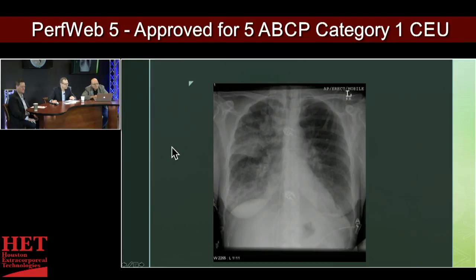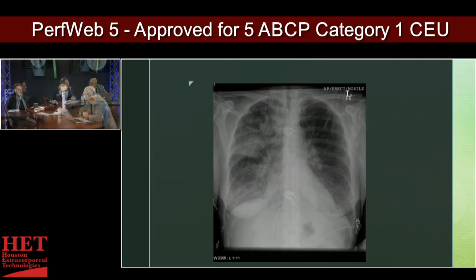If I were to tell you this is a patient that just got finished with a hard night of partying at the HET conference in New Orleans, and they were out on Bourbon Street till the wee hours in the morning, they passed out on the floor and got sick and threw up their last hurricane. They got short of breath and didn't feel well. They went to the emergency room because they were coughing, and they took that x-ray. Aspiration pneumonia. This is an aspiration. Yeah, this is kind of classically what you see. You see it on the right side.